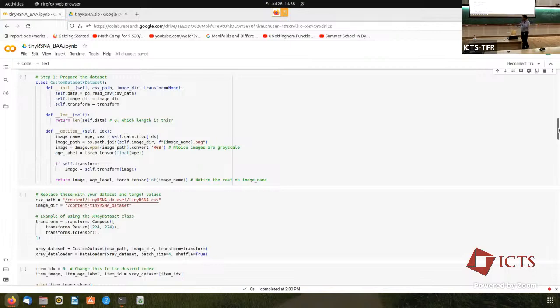That's the input size of the ResNet network that I have. So every network has its own input size. And in fact, there's a bit of nuance to it, which means that the input size can be variable and so on. But let's not worry about that nuance right away. Just the typical network input image size is what we are working with right now.